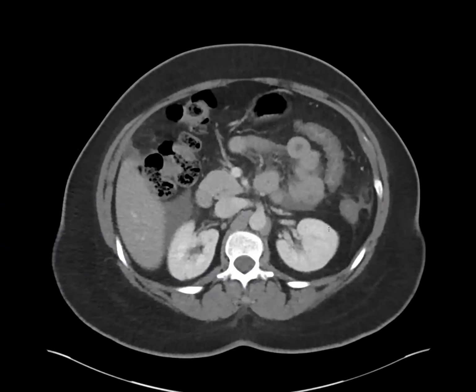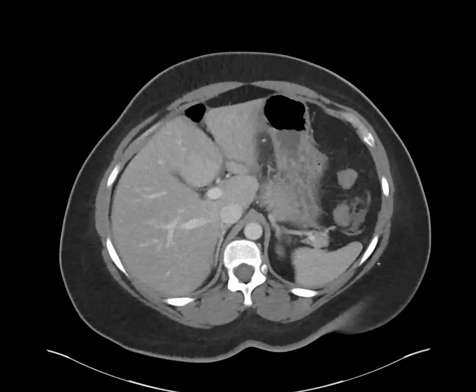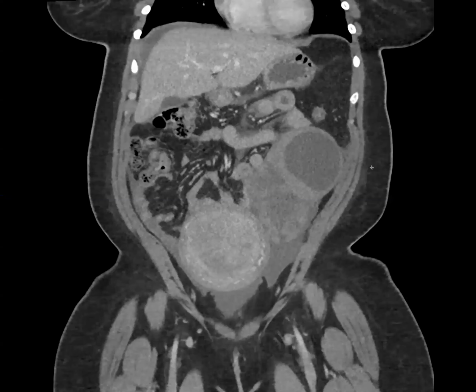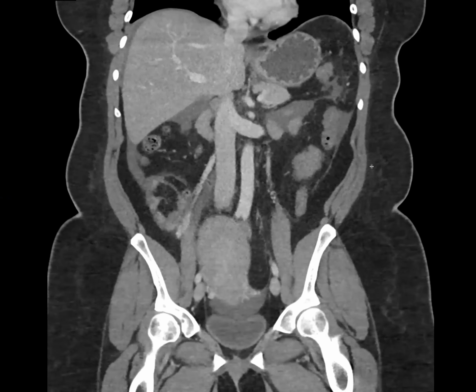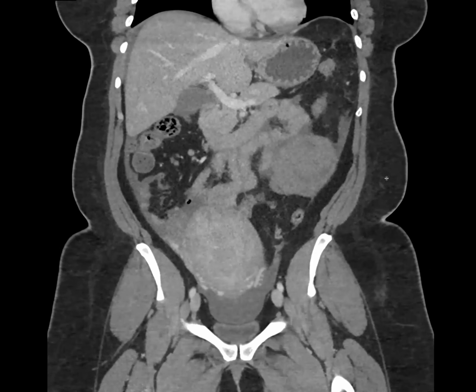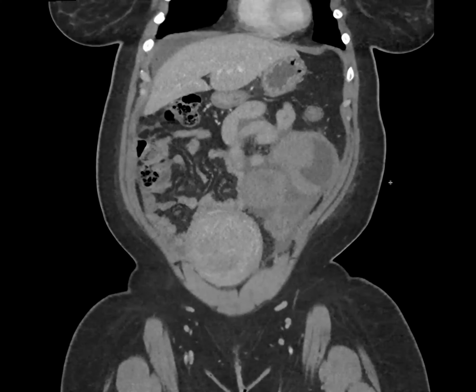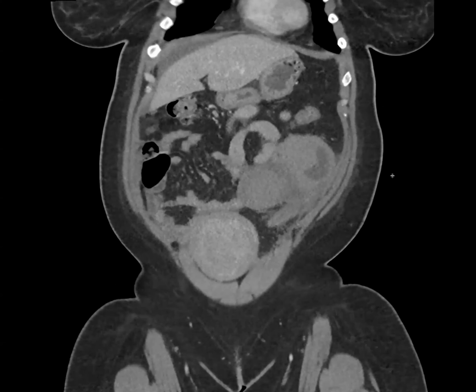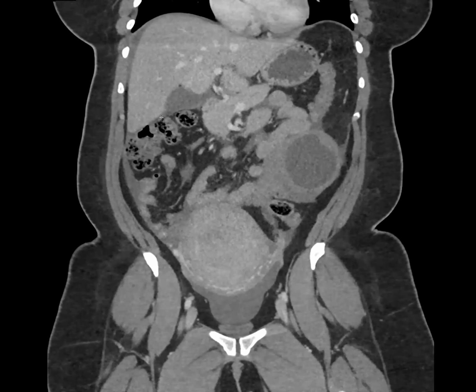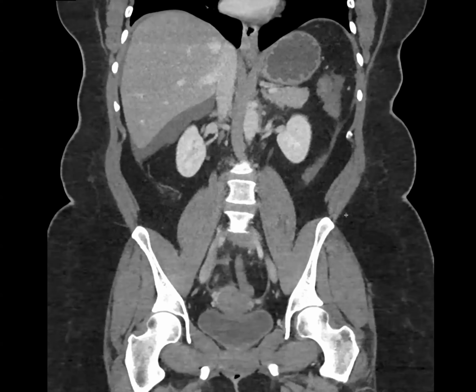I get tricked by torsion all the time. I think this peritoneal picture definitely tricked me, because it looked like carcinomatosis, but I guess it just is fluid. No Meigs syndrome, it looks like. So no pleural effusions? No. Although maybe that perihepatic fluid is Meigs syndrome. Yeah, very trace, but no pleural effusion or other findings. But this was all from torsion, I guess.